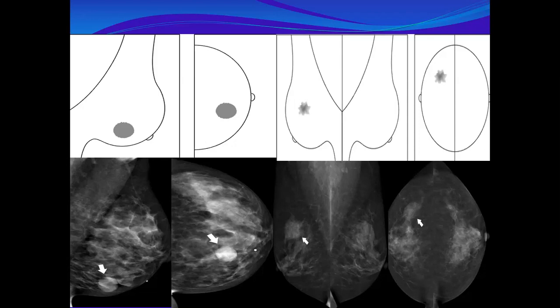And this is an ACR case, you see? They report it as a focal asymmetry, not as a mass. That is why I brought it, exactly to differentiate between them. They did not describe it exactly like this, I am just trying to explain for you. But they report it as a focal asymmetry rather than a mass. You see? Their description is focal asymmetry, not a mass.